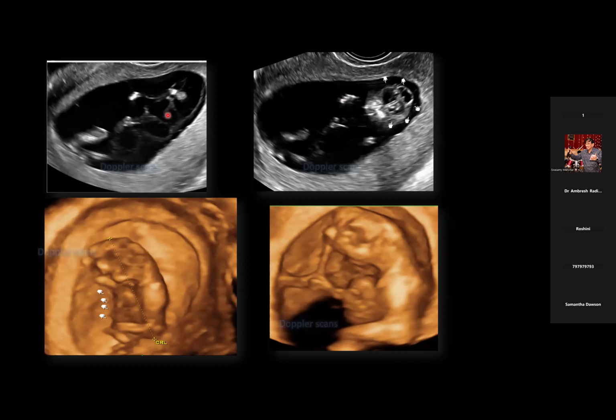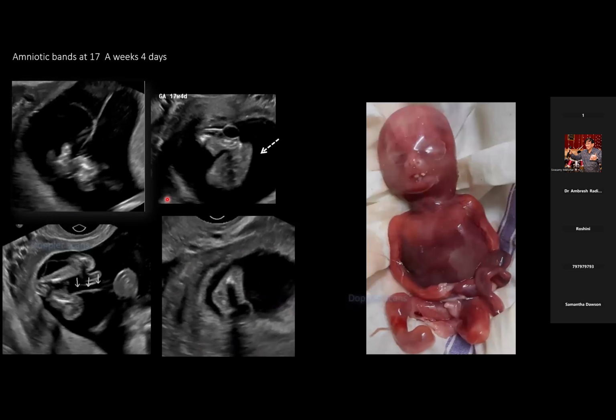So, this is a first trimester fetus where the fetus appears to be entangled in a net of echogenic bands, and there was also a cystic encephalocele and the abdominal wall defect. So this amniotic band syndrome would lead to bizarre non-embryologic limb, cranial, and thoraco-abdominal defects, also called the slash defects. So this is amniotic band syndrome at 17 weeks.